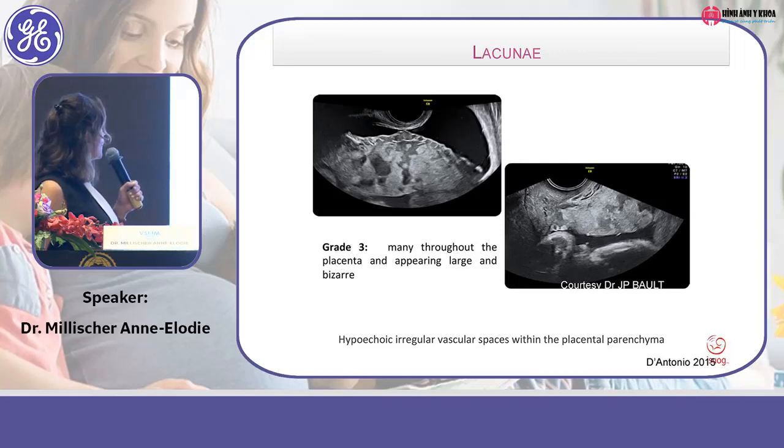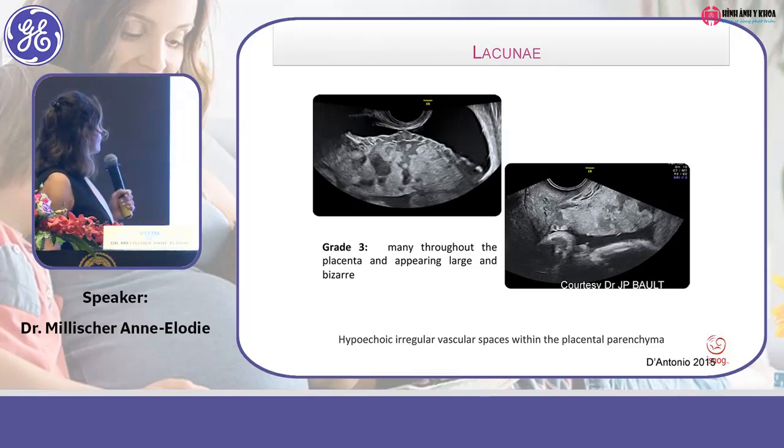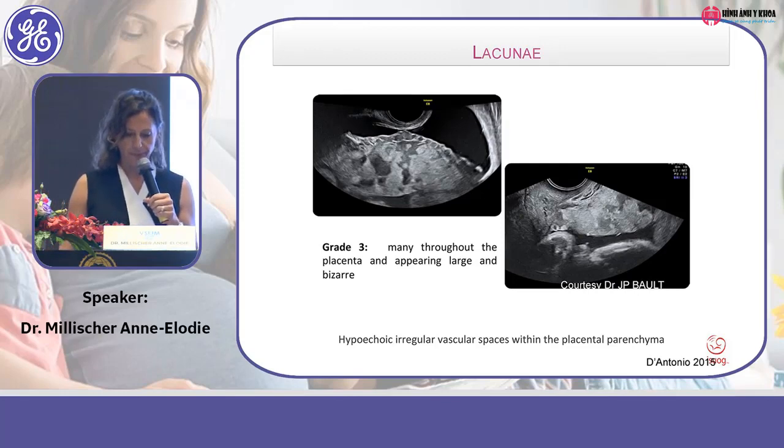It appears large and with irregular boundaries, as you have on this picture, with no hyperechoic ring. Cái xoang mạch máu này, cái bờ nó không đều, nó ngóc ngách tùm lum và nó lớn, và đặc biệt là nó không có cái đường echo dày xung quanh.